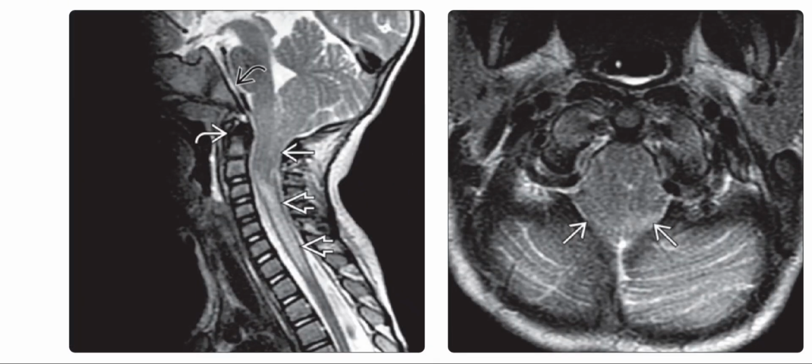So the left image is the sagittal T2 weighted MRI. It depicts the marked cerebellar tonsillar ectopia with normal tectum and fourth ventricular position. The clivus is mildly foreshortened and the dens is retroflexed. There is central intramedullary edema in the cervical spinal cord without frank syringomyelia, a finding that has been described as a pre-syrinx state. On the right image, we can see that that's the axial T2 weighted MRI, which confirms the displacement of the ectopic cerebellar tonsils through the crowded foramen magnum, producing the foramen magnum crowding.